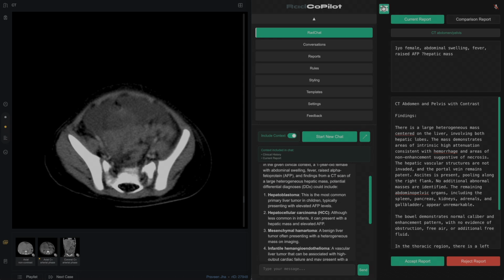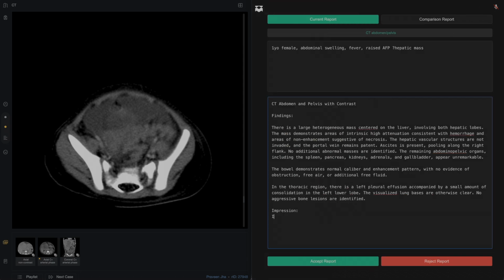Okay, so with that in mind, let's say in the context of a raised AFP, the most likely diagnosis is so. Okay, and let's finish there.